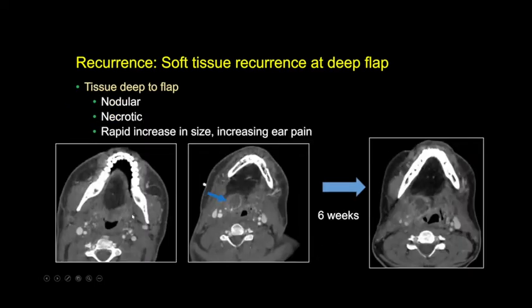Here's another patient who's had a treatment. He's radiated, has had bilateral neck dissections. We see no fat around the carotid or the jugular. That's a hallmark of a neck dissection. And here's the fatty reconstruction in the tongue. This particular image looks fine. Several slices inferior, we see a discrete mass. It's at the boundary of the fatty flap and the normal intrinsic tissue. It's mass-like, and there's peripheral enhancement. It's centrally necrotic. Those are the imaging hallmarks of recurrent tumor.